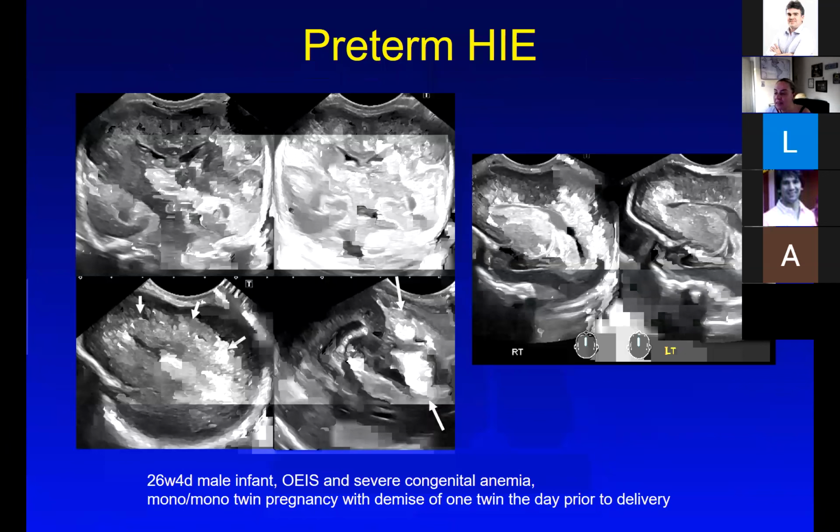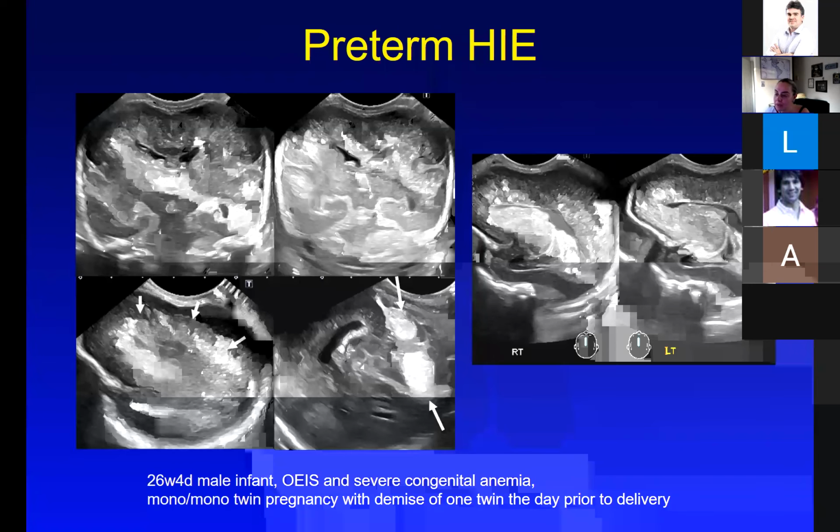I initially talked about hypoxic ischemic injury of the term infant, but it can also happen in the preterm infant. And depending on the severity scale, different parts of the brain can be affected. In the preterm infant, the most vulnerable area to HIE is initially the periventricular white matter areas. If it is severe enough, it can further include the basal ganglia, thalamus, brainstem, and cerebellar regions too.